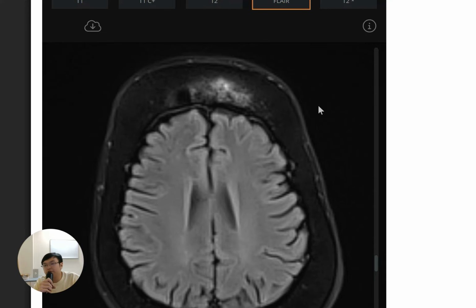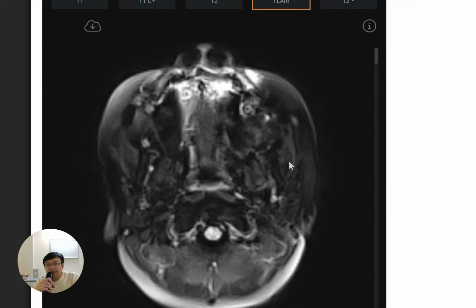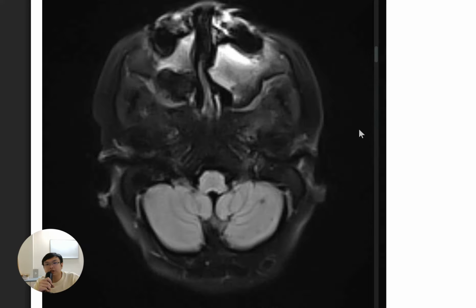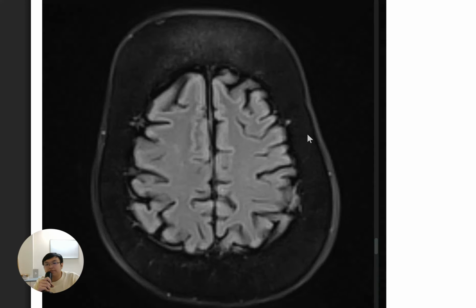Sometimes the bone confinement is not enough for those hyperplastic marrow. They can grow out of the bone, what we call extramedullary hematopoiesis. So next time when you look at other regions, take a look at whether these bone changes are generalized, because we are not going to only ask the skull to make the red blood cells. We will ask the entire skeletal system, especially the axial skeleton, which has the majority of the red marrow, to have hyperplasia. So it should not be very localized bone changes.